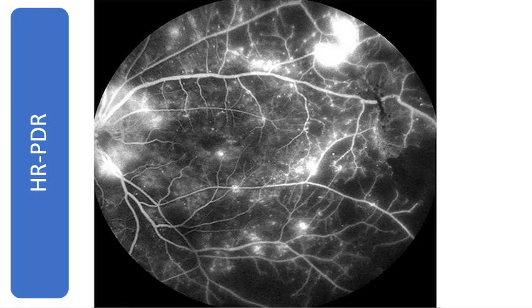So if we look at this fundus fluorescein angiogram, we can say that there are several hyperfluorescent microaneurysms. In addition, there are several leaky neovessels. Some of them are present near the disc, and those are called NVDs, as shown on the left-hand side of the photo. And some of them are present away from the disc area, and those are called NVEs.